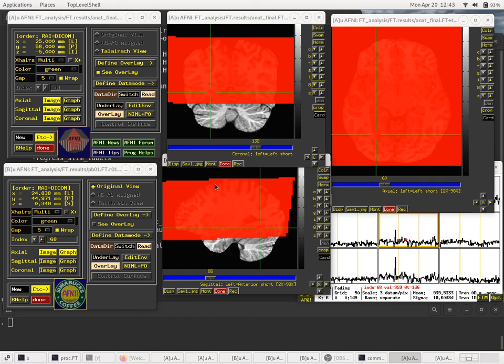Anything outside of this mask is where the all-one data set, when warped to final space, had at least one time point where it lost data. And therefore, we chopped it out of the extents mask. So that's all this is. It's a mask that says across all time points we should have valid data for our EPI time series.